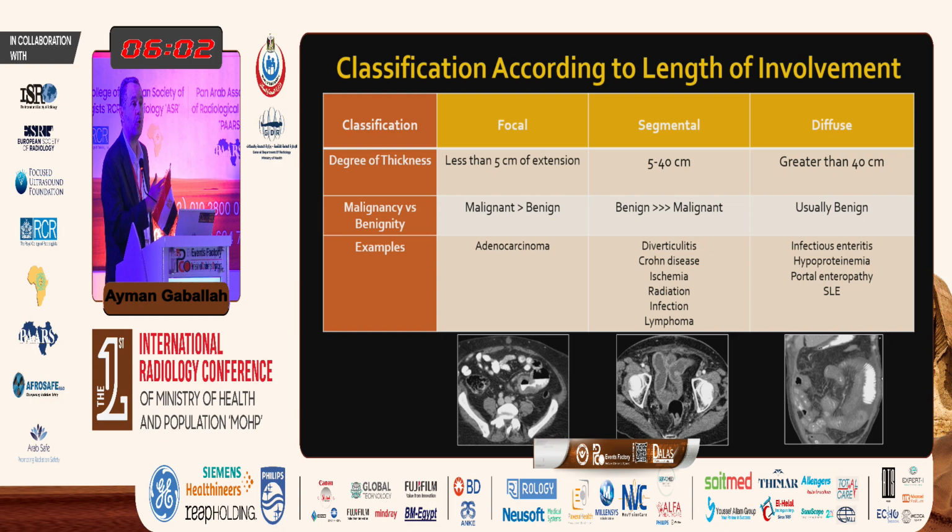And as you know, we call it portal duodenopathy, portal enteropathy, portal gastropathy, portal colopathy. This is important so that you don't overcall, especially in patients with cirrhosis and portal hypertension. Be careful about that. Yes, it can be infectious enteritis, but give the possibility of portal something like portalopathy, then add the possibility of enteritis or colitis. But be careful, because this is a very common finding in patients with portal hypertension. And this case was a patient with hypoperfusion, as we will see.